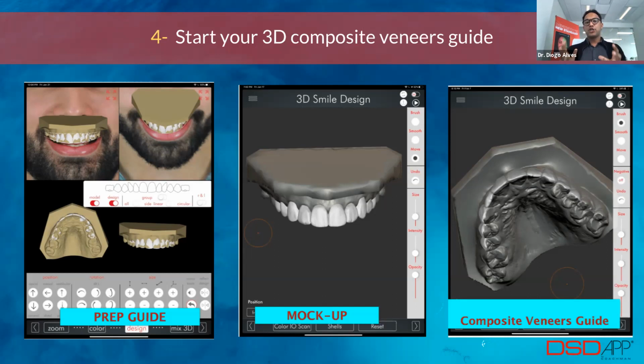That is something that you would be taking a note with the patient chair side. You would analyze the overjet and the overbite. You would analyze the non-working cusps to make sure that those were in an ideal position. Then you would set that new smile curve based on the curve that you're creating in the app, and you would place those 3D teeth over that smile curve. And that would create the new smile curve, the new curvature, the new buccal corridor of your design.